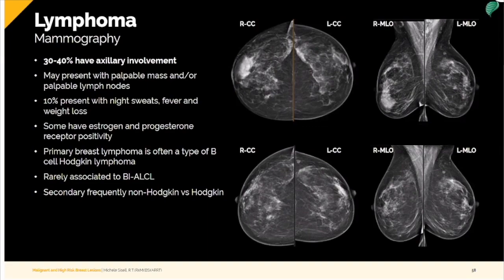In the images, you can see the area on the top mammogram is denser and brighter compared with the mammogram of the exam in the previous year of the same patient. This is a 65-year-old patient who has known lung cancer and presented for her annual mammogram. The patient felt an unusual area in her right breast. She did not tell her primary care physician, so she went ahead and had her screening mammogram. Mammographically, the interpreting radiologist would immediately know that the right breast needs additional workup from its appearances.